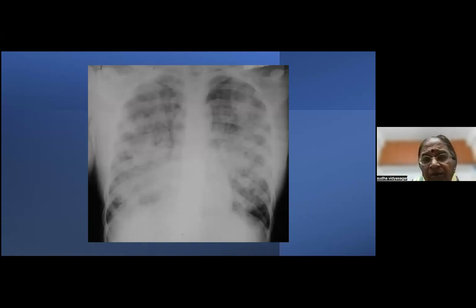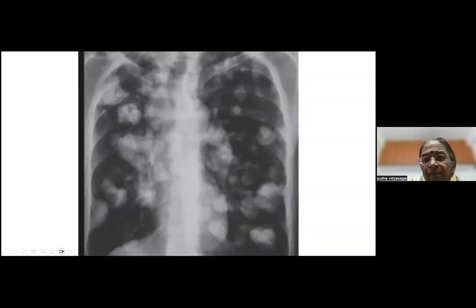You had COVID, you had H1N1, you had all kinds of pneumonias. You can have an aspiration, you can have any sepsis causing something like an ARDS, and it is causing patchy lung opacities. All these are possible. And we cannot give a differential on this without understanding the clinical picture. But a bilateral pneumonia is probably your best bet.